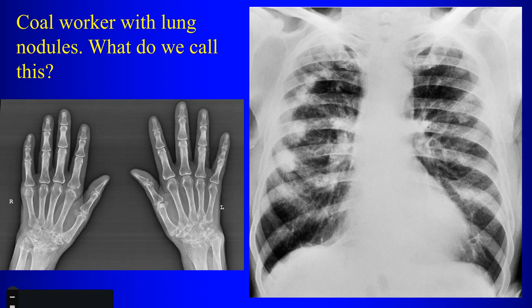What are the nodules in the lung? See the nodules? What are these nodules? Non-cavitary. Yeah, I know, but what are the nodules? What makes the nodules? This is a case of Caplan syndrome. What causes the nodules in the lung?